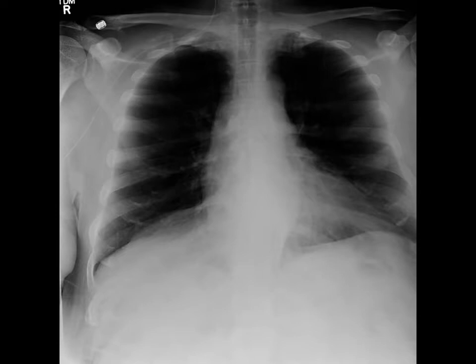So if you didn't know that a PIC had been placed, you'd want to be able to see this line and realize that it's thinner than a central catheter and that it's coming from further in the periphery, so it's probably not a central line placed in the internal jugular, but rather a PIC placed peripherally and threaded towards the heart. Unfortunately, in this case, this PIC deflected up into the right IJ. So of course this PICC would have to be replaced as well.